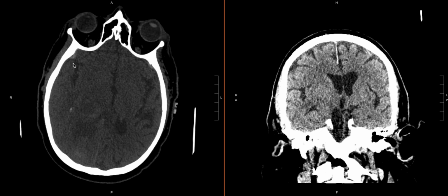Now, this is very tricky because its location is near where we see this typical dural thickening, which is what we see on the other side. But this shape, it's too much. It's too enlarged. It's asymmetric to the other side, so this is a very small subdural.